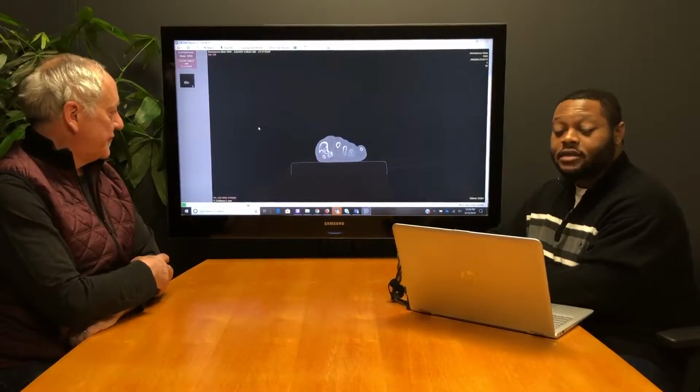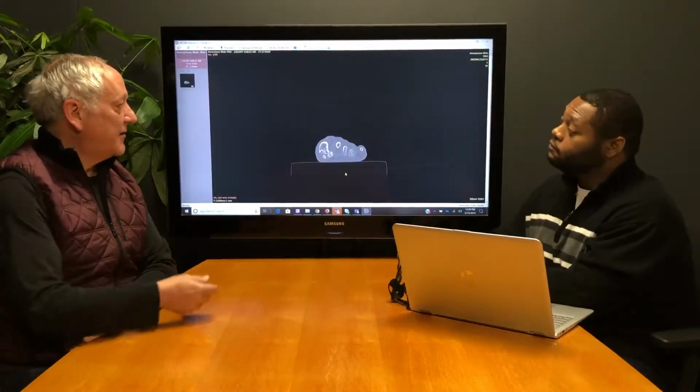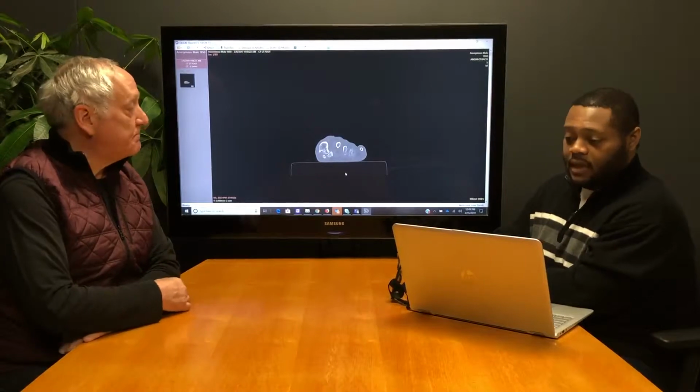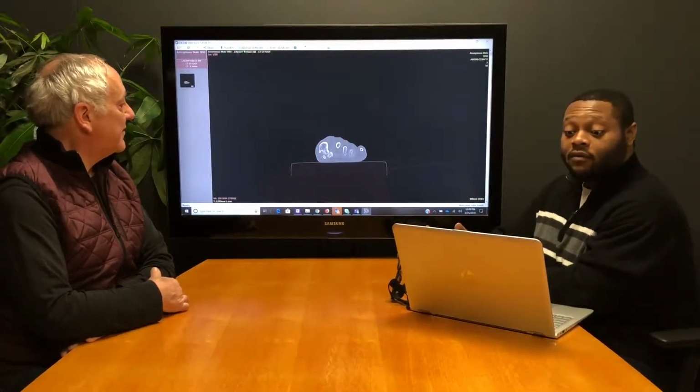And that'll allow us to start seeing our new series on the PAC server. And now we've gotten our model downloaded off our server, showing that we did have it up on our PAC server, and now we can go ahead and order the model, right? Yeah. So make sure that we once again have the series that we want to create a model from selected.